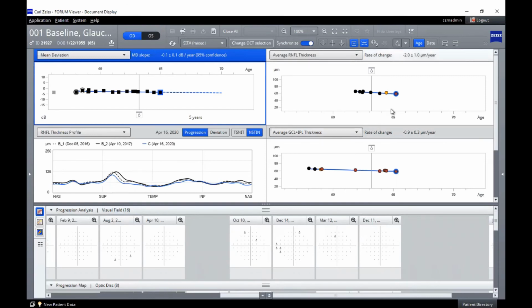Well, and to that end, as we were just having that, you were sharing with me what you're using. If you take a look, I did change that baseline. I reset it to some of those dates back in 2016 and 17. And we can see, to your point that you had used on one of the static reports earlier, that the rate of change is significantly different. All those little red dots that showed up before, indicating a clinically significant change over time, we can see and contrast that with the separate image from the ganglion cell, which is still showing that old set of data back to 2013.